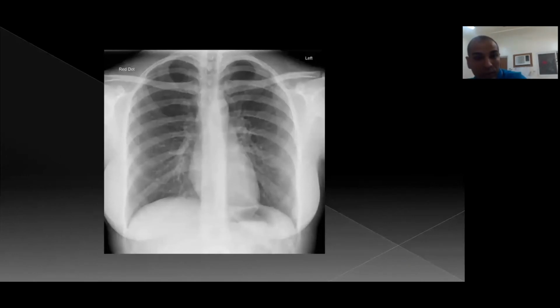Look at this one. Can we revise our checklist? Yes, we can. Do you have pneumothorax? No. Do you have pneumomediastinum? No pneumomediastinum. Pneumopericardium? We don't have any pneumopericardium. Consolidation and cavitations? We don't have. Nodules or masses? We don't have. Fibrosis, reticulation, something like this? No. Emphysema? No. The diaphragmatic border is clear and maintaining its contour.